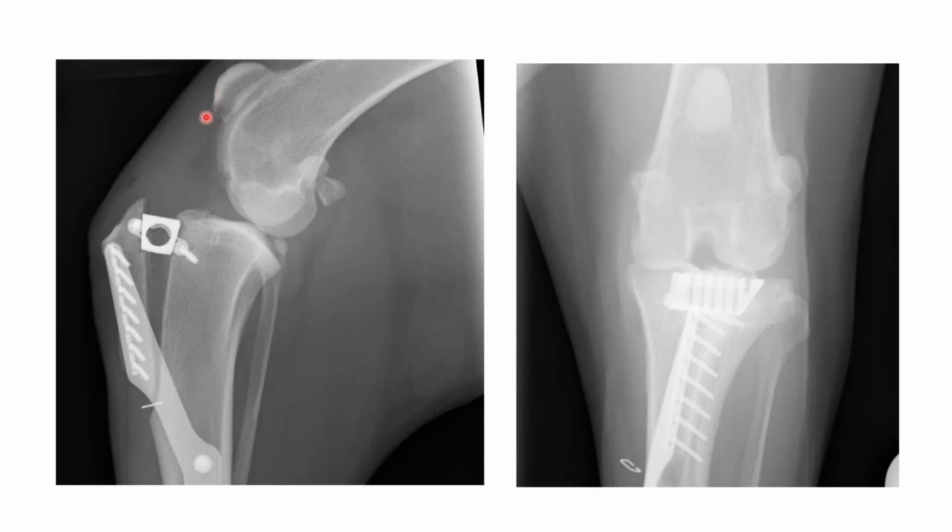So there are some osteophytes at the level of the apex of the patella and on the trochlear ridges, and also on the tibial plateau and this lateral epicondyle. There is some increased opacity of the stifle joint and potentially some cranial displacement of the fat pad. But what's most significant is this radiolucent halo associated with this cage implant, and that was confirmed as being secondary to an osteomyelitis that's occurred as a result of this surgery. So this is an osteomyelitis associated with this cage implant that's been used during this TTA.